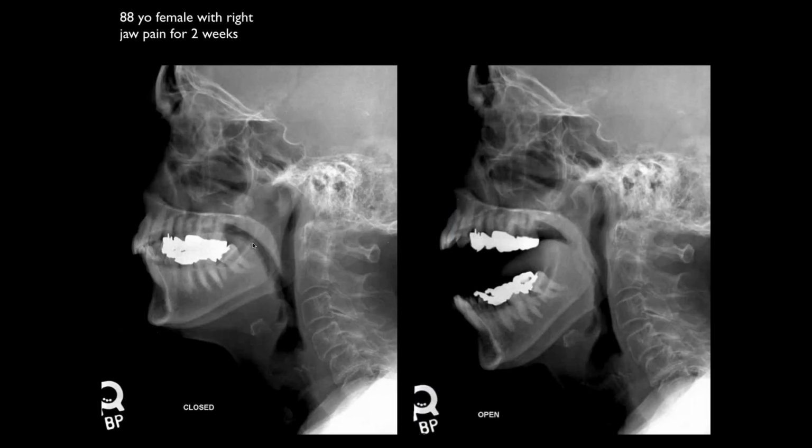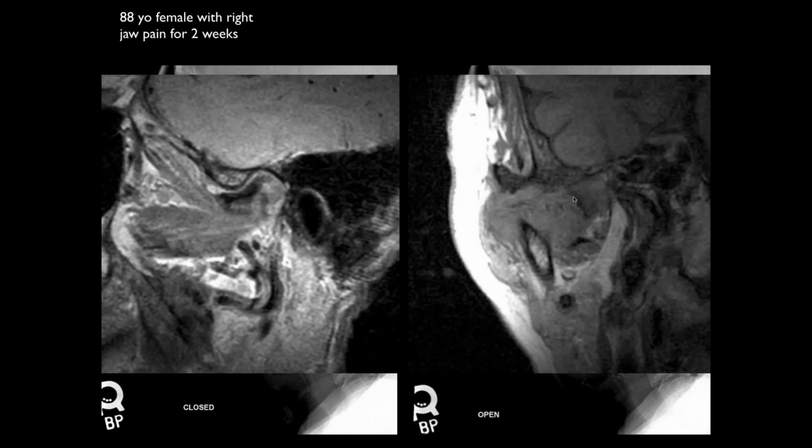Okay, Sahar, what do you think of this one? Okay, a female with right jaw pain for 2 weeks. And we have radiographs. This is what we looked at before we had CT. We have closed mouth and open mouth. It seems the condyle is moving a little bit anteriorly, not completely probably. But clearly they're opening their mouth and we're getting some rotation and translation there.